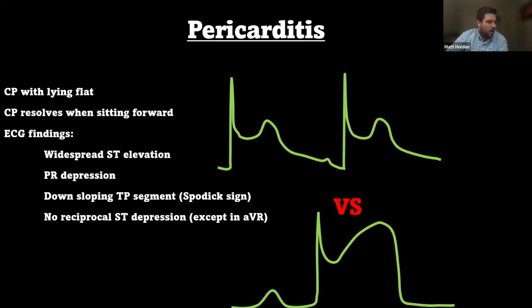So, pericarditis as well. Yes, Missy. It's really difficult to just look at some kind of EKG. I was always taught to diagnose pericarditis at your own peril. So just make sure that you're not just throwing pericarditis around all the time.